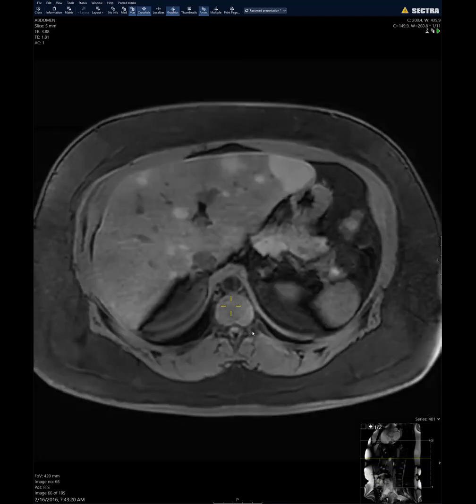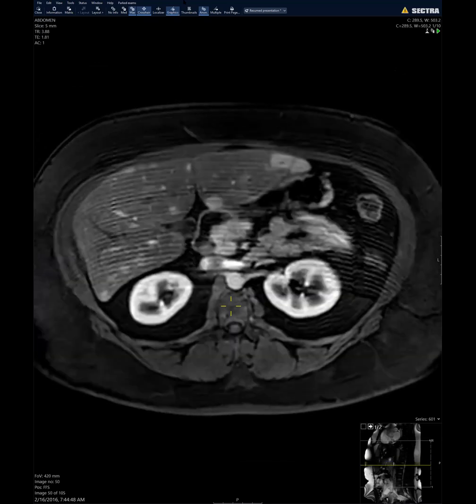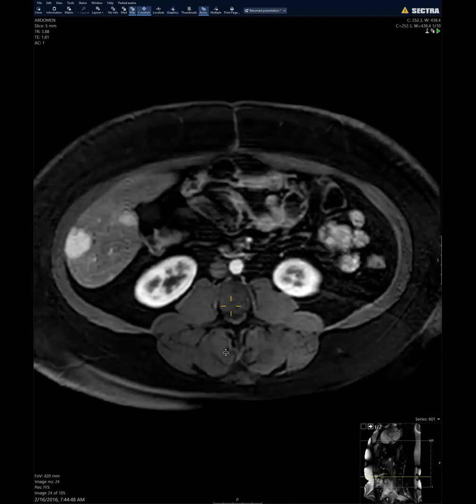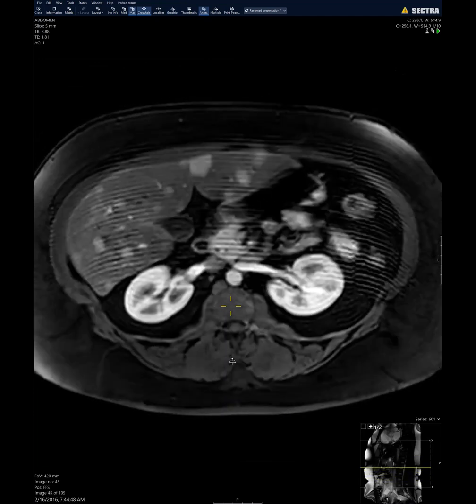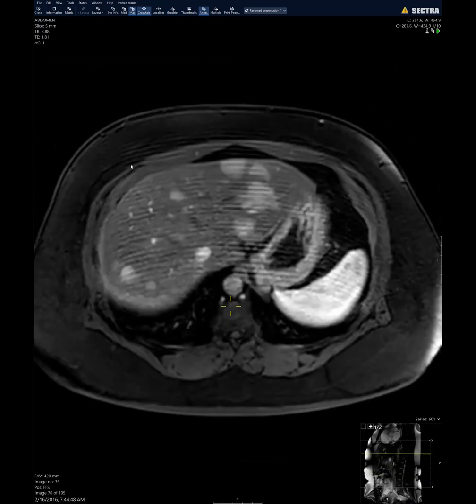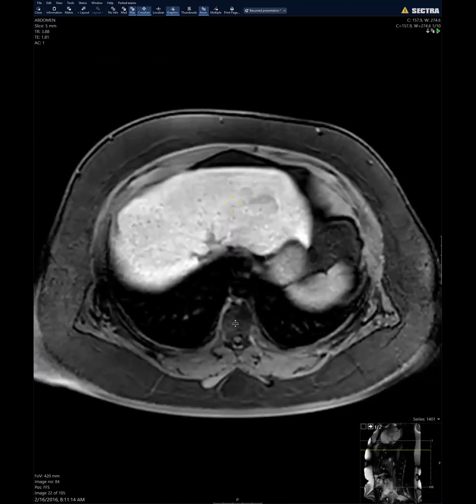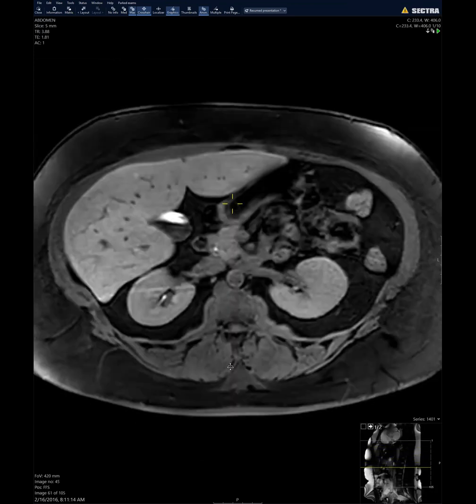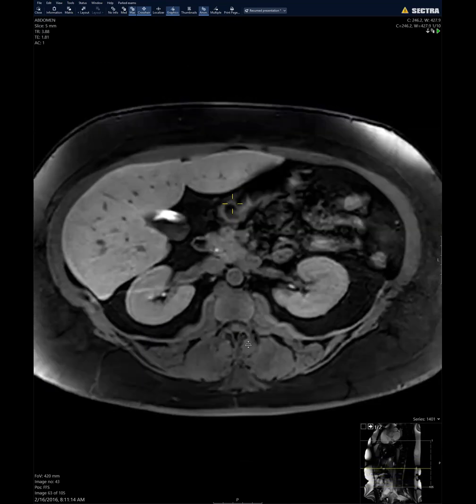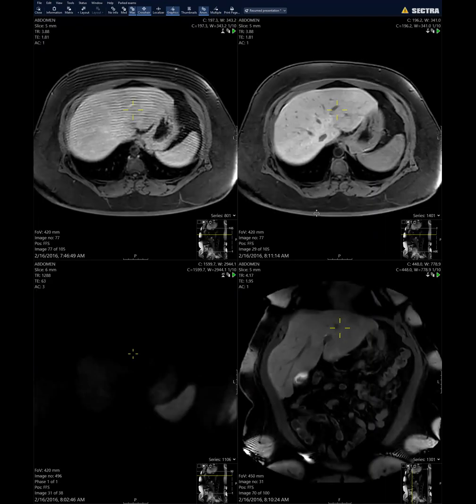Yes, and this is the arterial phase. So just wanted to know everybody's thoughts on this. Yeah, it's nothing complicated. And we also have EOVist on this patient. We gave EOVist, so these are the 20-minute delayed images. So they seem to be retaining on EOVist. Yes, no obvious washout.